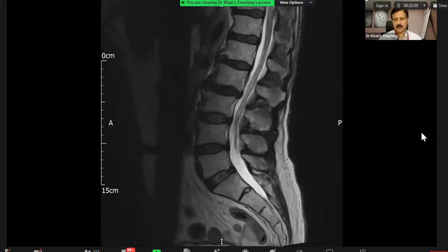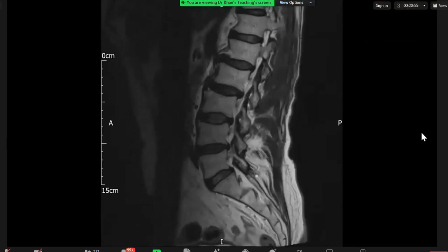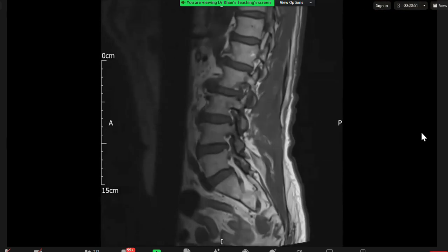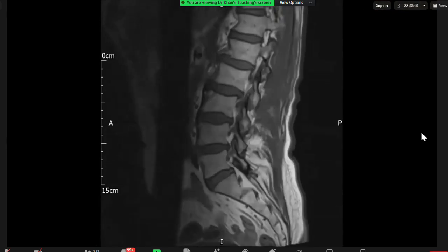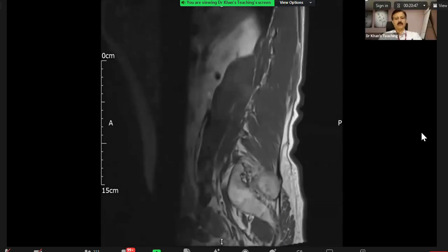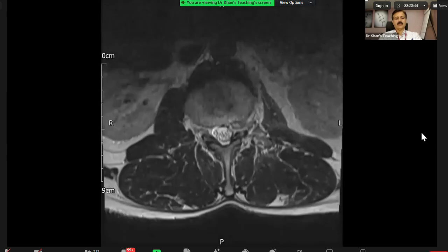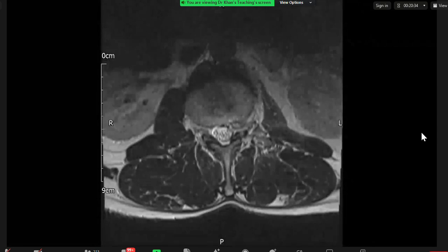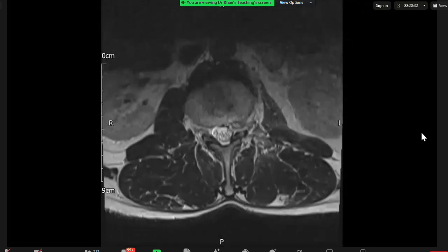Should I do that? Yes. You are having problems, then I can take it. No, it's fine. I just didn't want to go to axial. Please keep going. Okay, so in the left foraminal zone, there is a disc protrusion that is causing.